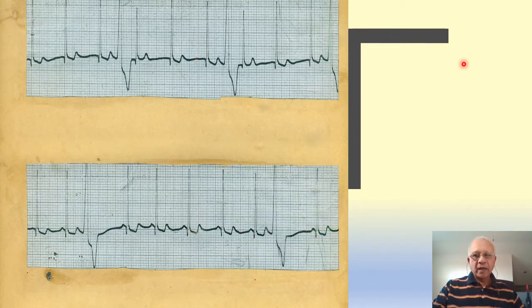So the upper panel and the lower panel, the QRS complexes, that is, which are not the ventricular premature beats, are showing a difference in rate. And in the upper panel, you can see the QRS complexes are not preceded by P waves, which means it is coming from the junction, isn't it? Now, what is the rate? The rate I said is 68 per minute. So, if a junction is beating at 68 per minute, we call it accelerated junctional rhythm, isn't it? So, the upper one shows an accelerated junctional rhythm along with interpolated ventricular premature beats.